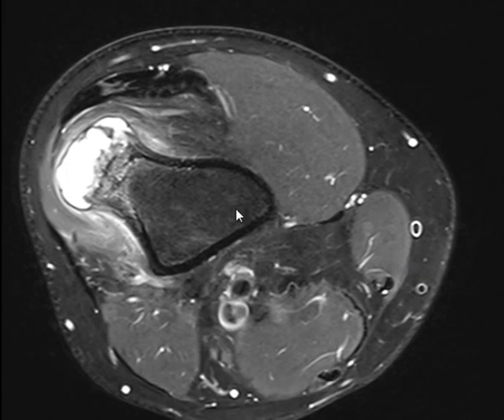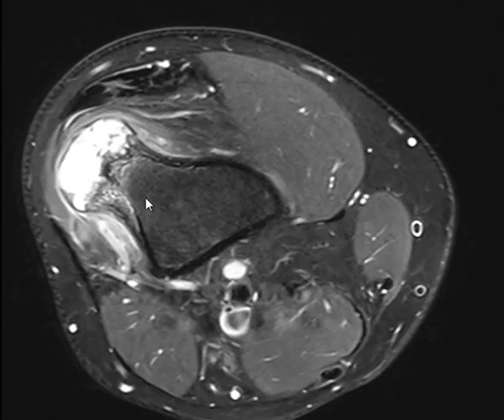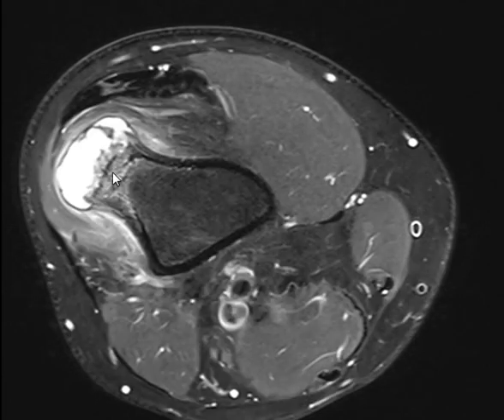Extending from the medulla, the lesion is in contact with the bone. Good. And the medulla of the bone is adjacent, continuous with the medullary cavity of the bone, of the lesion. Good. So osteochondroma or exostosis. Yes.